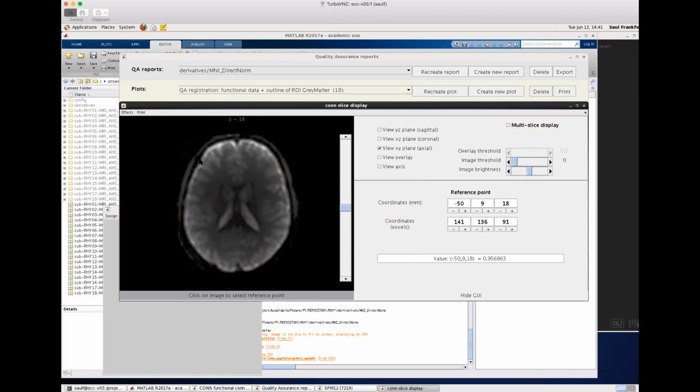So there are huge changes. If the person just happens to move slightly to the left or to the right, the actual BOLD signal changes a lot, because a little bit to the left is pretty much 0, and a little bit to the right is pretty much 100. Anything where you see large changes like that, like here in the ventricles, the same thing happens. In the ventricles it's kind of the opposite, because the BOLD signal tends to have higher activity, but it's the same thing.